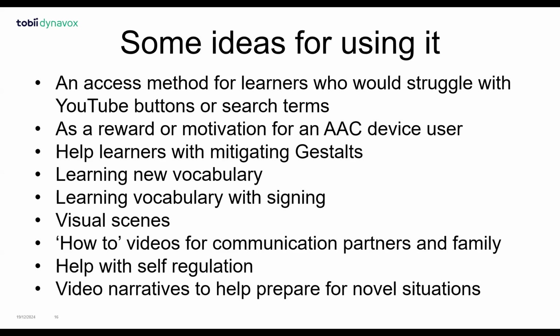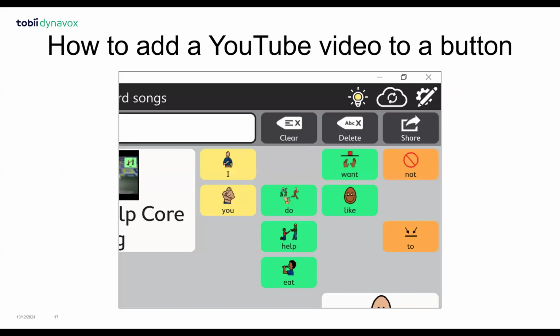So there's some ideas there, but what we really want to hear at the end of this session, if you've got time, is some of the ideas or resources that you use in video that we can perhaps tap into and have a look and share with other people as well. So we're really looking for your great ideas. I'll quickly show you with some slides how you actually add a video to a button, but I'm going to spend more time doing this in practice.